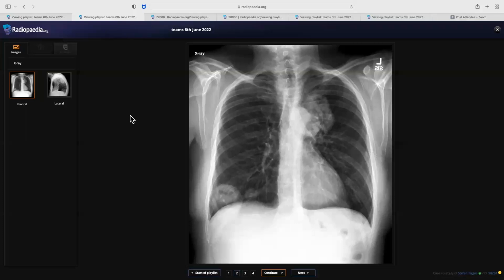The lesion has well-defined lateral, upper and inferior margins, suggesting that this lesion is most probably pulmonary in origin. Otherwise, I cannot appreciate any pneumothorax, and the cardiac shadow is unremarkable, as well as the bony structures. This left upper lung zone lesion also shows central areas of lucency.